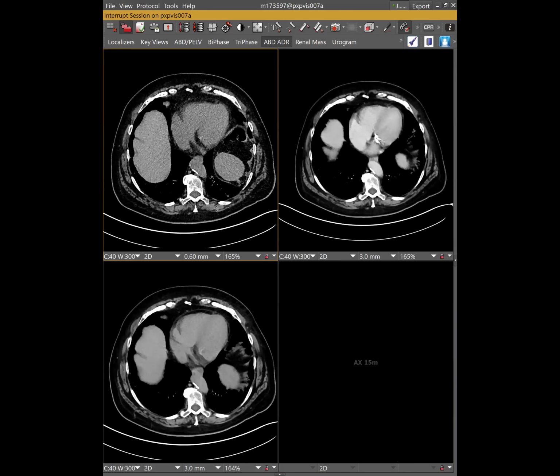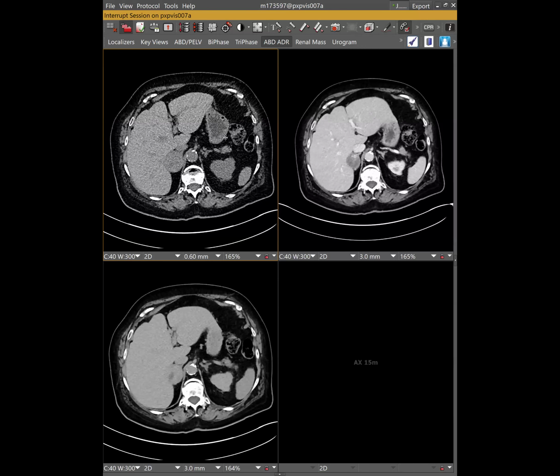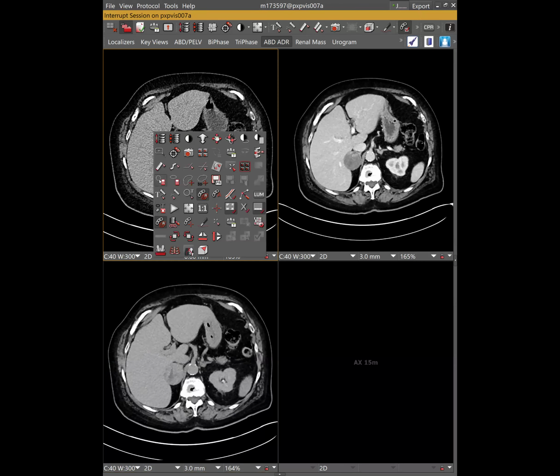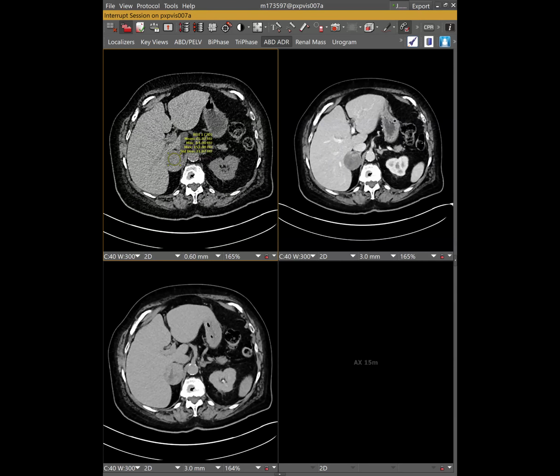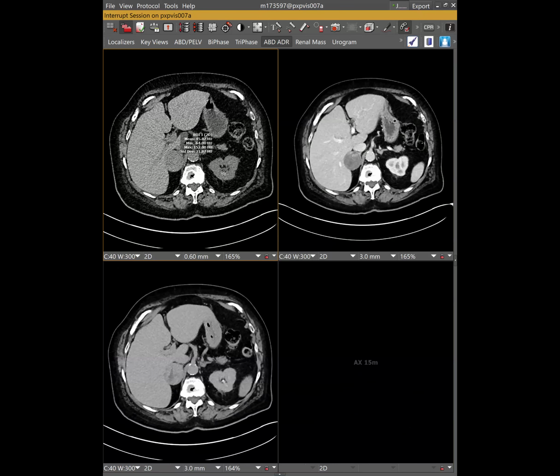So you can see on CT, just to prove it, they asked for an adrenal protocol for whatever reason. I don't really know why, but you can see that nodular discontinuous enhancement looks more impressive here, and then it gradually fills in. What's the kind of density on the pre-con? On the pre-con, she wants to know if it's more than 43. It is. Look, it's 46. So that's suspicious.